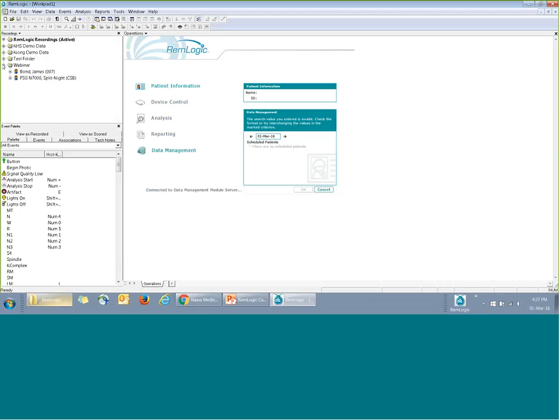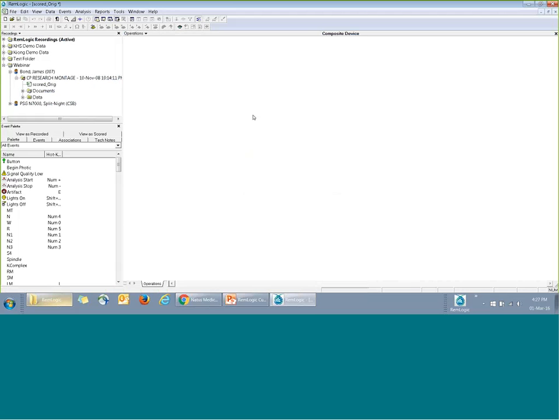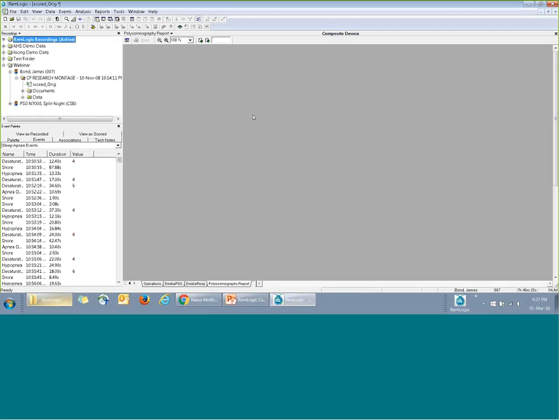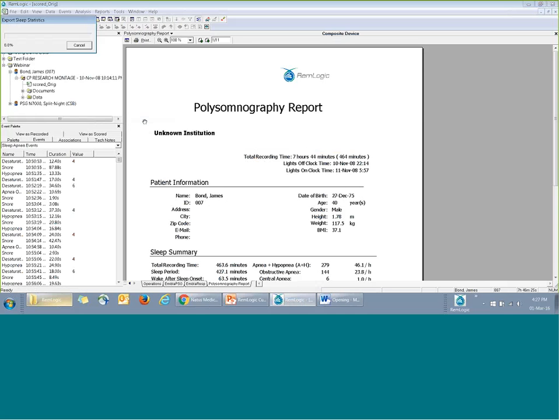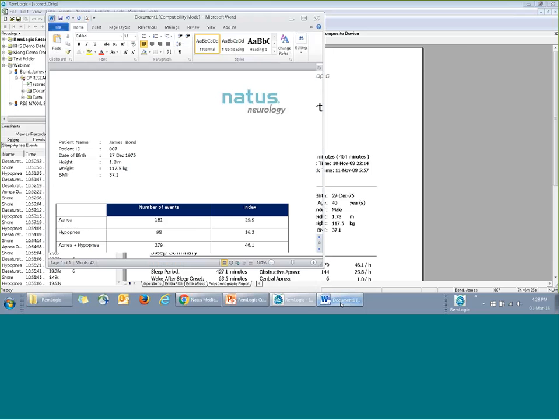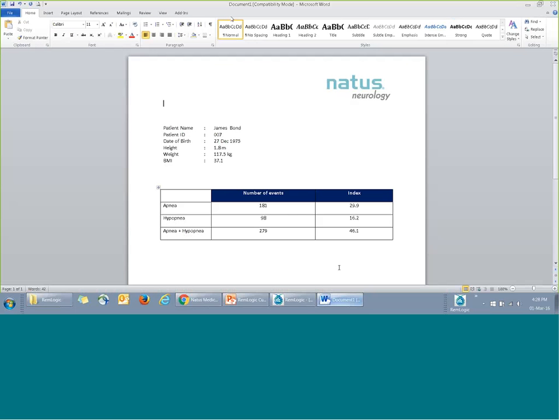Okay, so I'll just open my data. There you go. I just generate the report. There you go. So this is the end result that we have from the one we did. Yes, I actually saved it. Okay, let me just show you again.